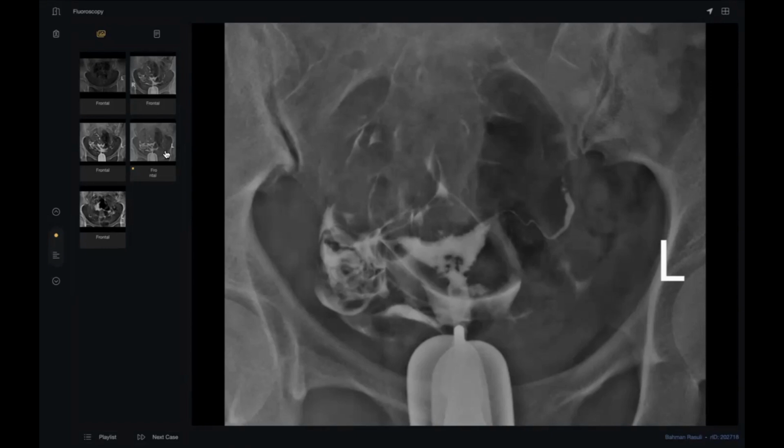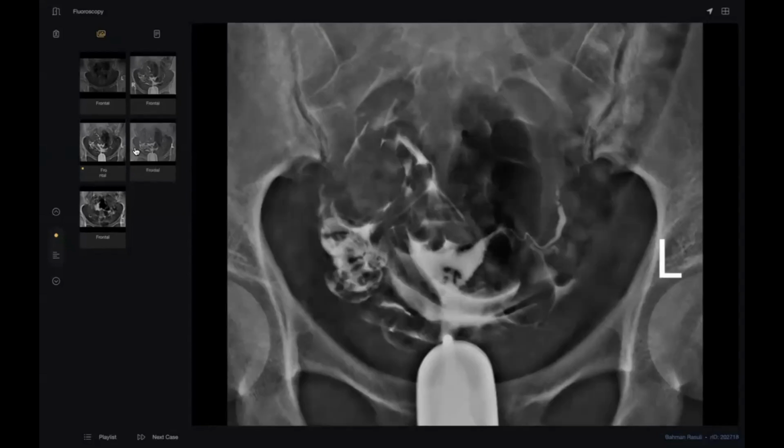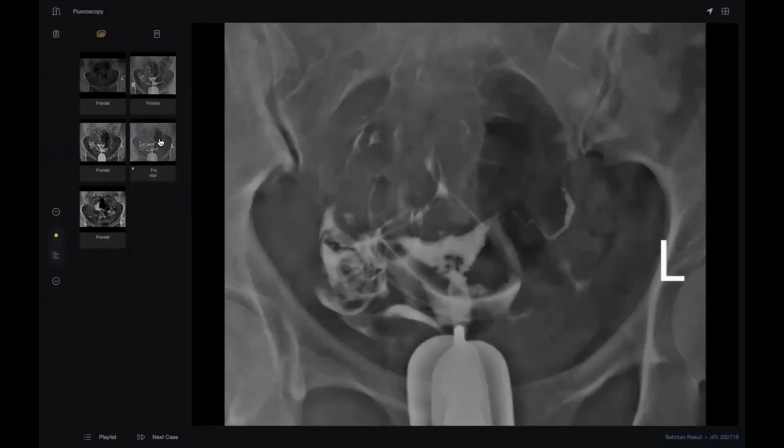What's your diagnosis here, doctor? Some adhesions, so most probably there are some synechiae or adhesions within the endometrial cavity. Excellent. What is the name of this disease? Sir, usually it's in tuberculosis and also post-surgical, post-surgical Asherman syndrome.